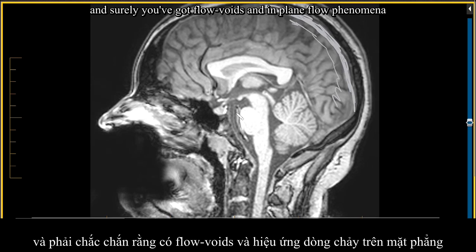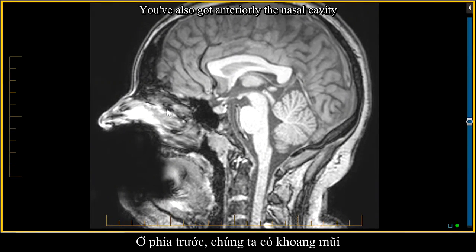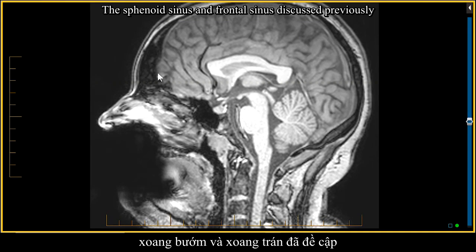Anteriorly, you've got flow voids and in-plane flow phenomena in the basilar artery and in the basal plexus of vessels and/or veins. You've also got anteriorly the nasal cavity, the sphenoid sinus and frontal sinus, discussed previously.